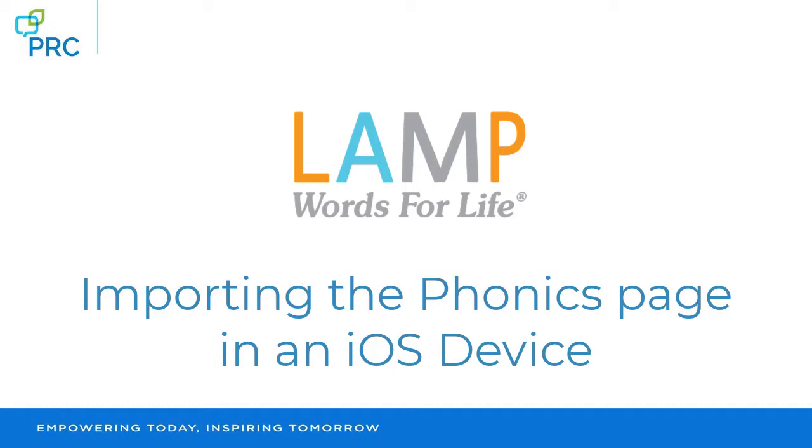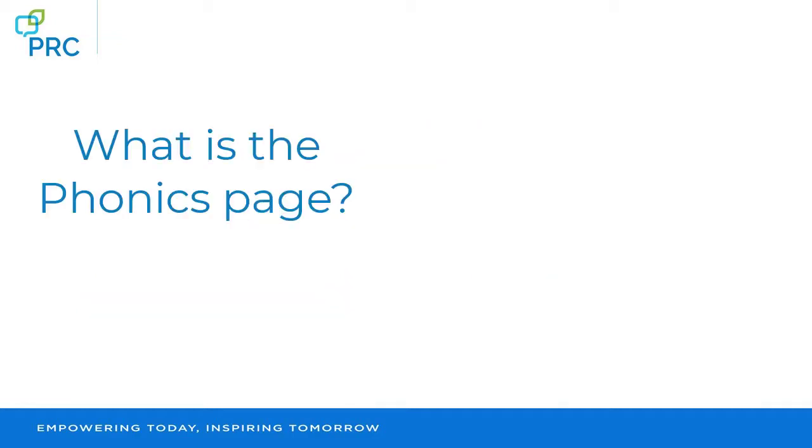Importing the Phonics page in the Words for Life vocabulary app in an iOS device. This applies to the Words for Life vocabulary when used in a PriO, a VIA Pro, or an iPad. What is the phonics page?